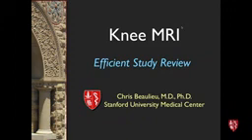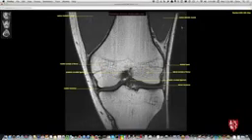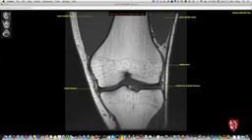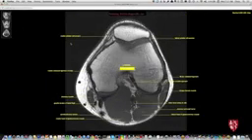So what I have is a number of cases teed up in Osirix to review directly in a PACS environment, and just a few slides. One thing I wanted to point out in the beginning is that Baudot and helpers have a really nice atlas of MSK anatomy on xrayhead.com. On that, you can scroll interactively through these sequences. So you have coronal, sagittal, and axial, and they're nicely and accurately labeled.